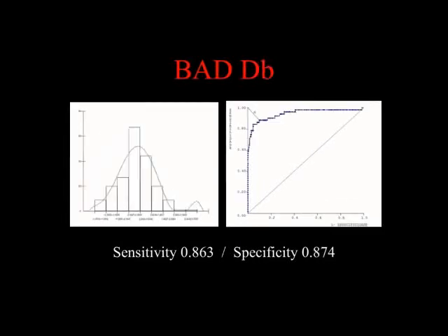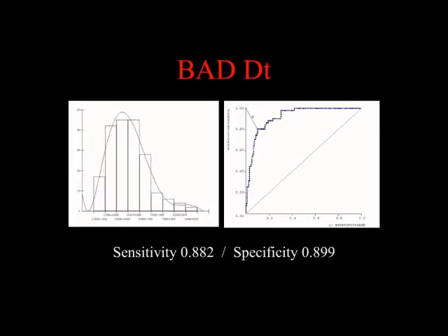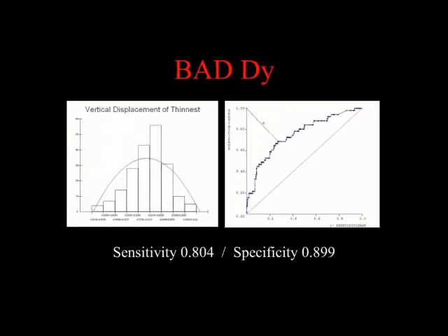This is the back surface. You'll see the tracing. Here is pachymetric progression. And this is the thinnest point, the actual value of the thinnest point. And this is the location. And notice immediately when you see the location at the graph of all the parameters is the worst. And again, that's why that is a fairly low-weighted parameter.